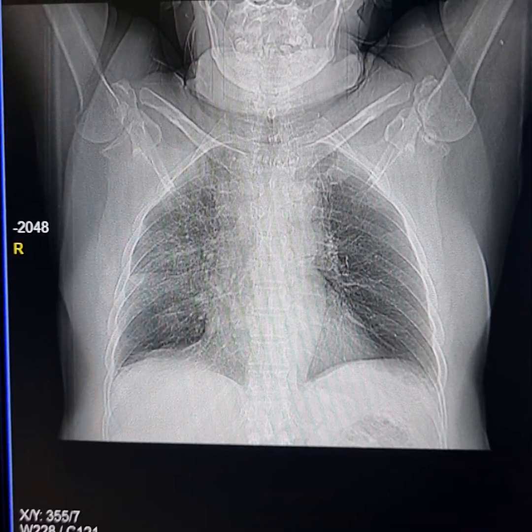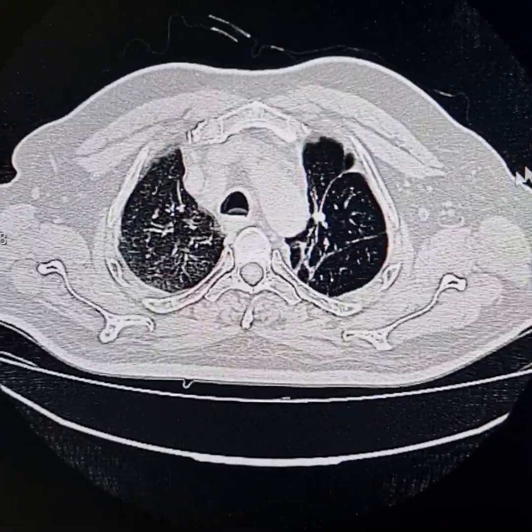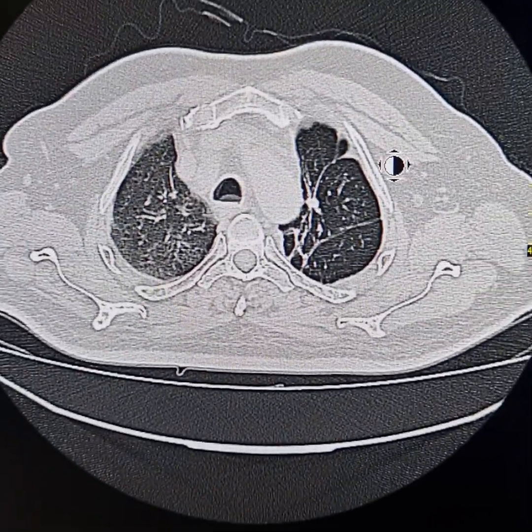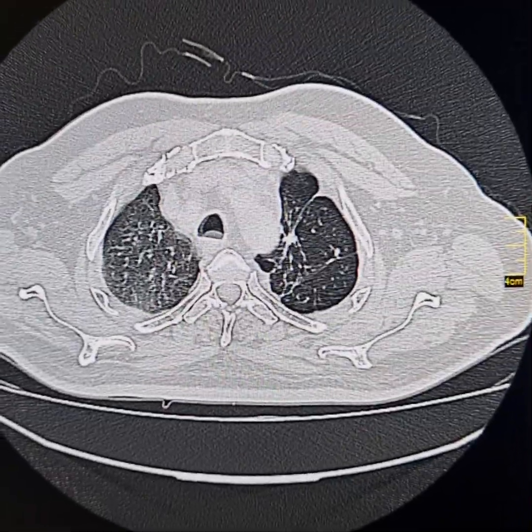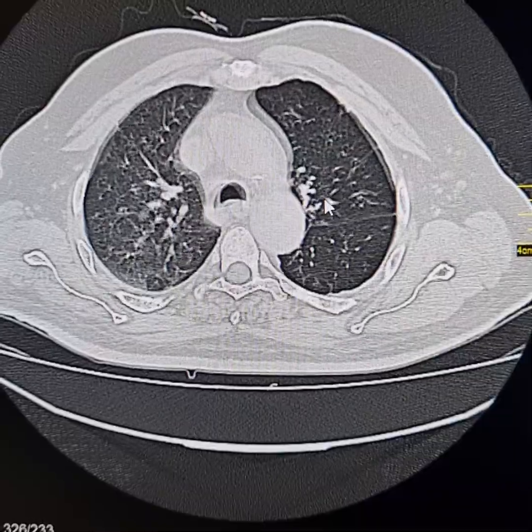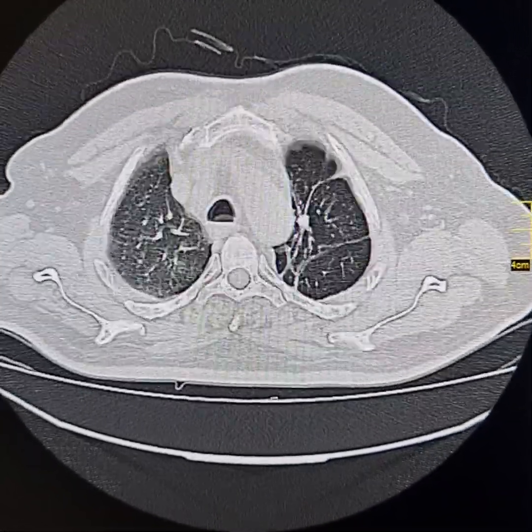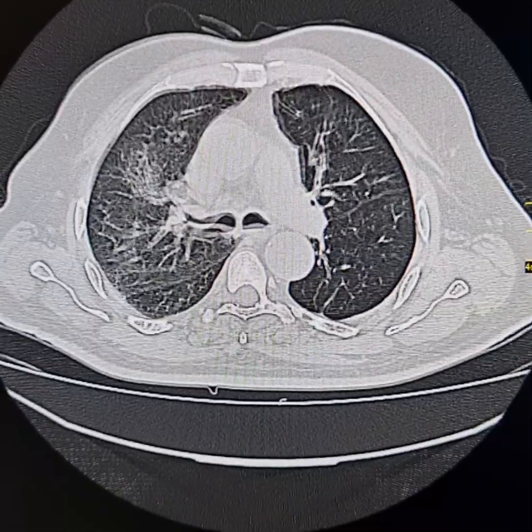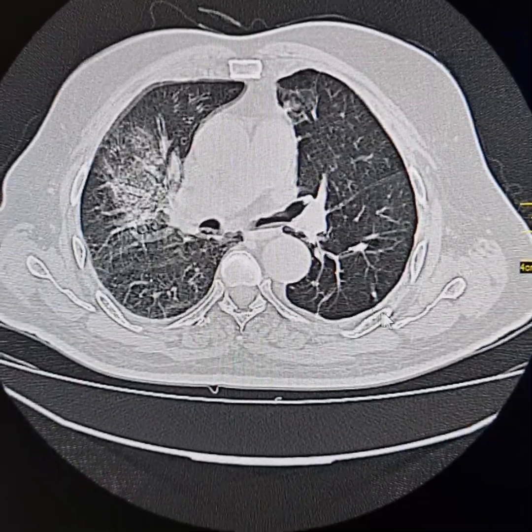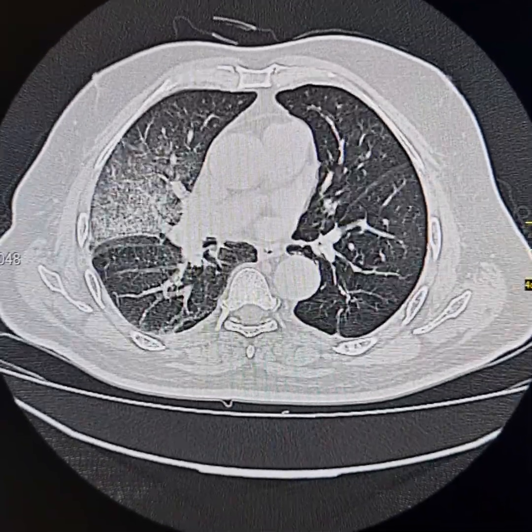Now I will show you the HRCT images. These are the discrete nodulostriate shadows suggestive of previous tuberculous infection involving the apico-posterior segment of the left upper lobe and the apical segment of the left lower lobe. At places there are nodular calcifications as well.